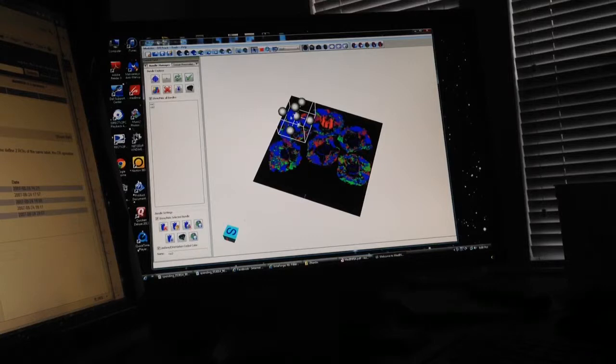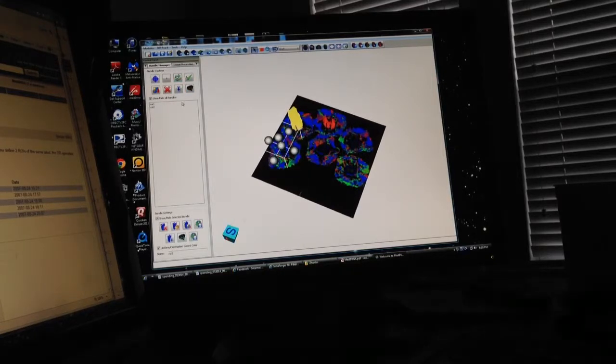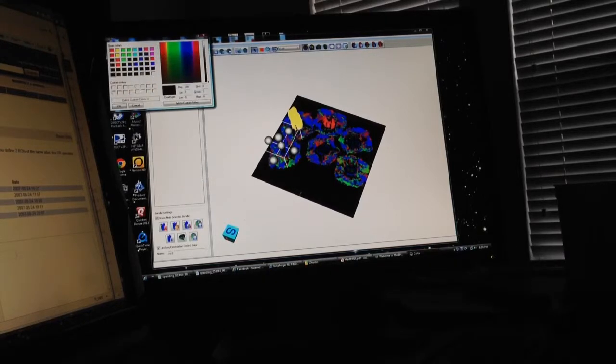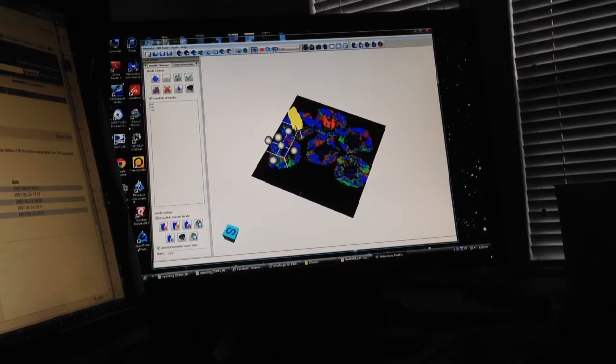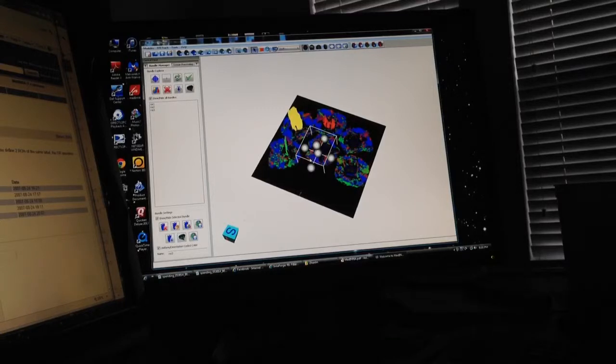Alright, then we're going to go down here to another area, reset. Notice we can see those fibers now in that box. Navigate into it, there you go. Validate it, ROI3, pick a different color, green, click OK. Anyway, you're going to do this for each one of the different boxes. And you'll notice now that we have our 3 ROIs right there showing the bundles.